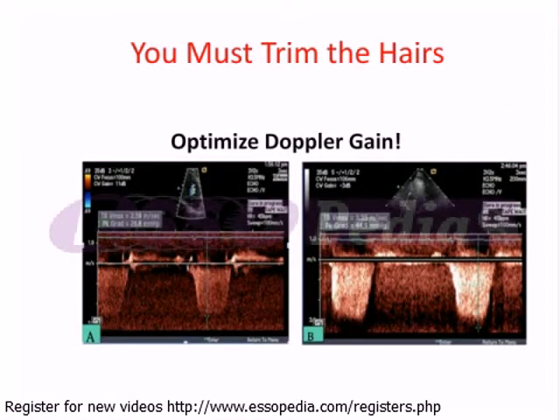Blooming of the Doppler signal may result in significant overestimation of the right ventricular systolic pressure. In the example that I had shown initially, while the contrast was not used, the extreme outer edge of the envelope was taken and the gains were not optimized, resulting in a significant overestimation of the SPAP. In this example as well, the SPAP without overgaining is 27 millimeters of mercury, but when the gain is used excessively, the PA pressure is overestimated as high as 45 millimeters of mercury.